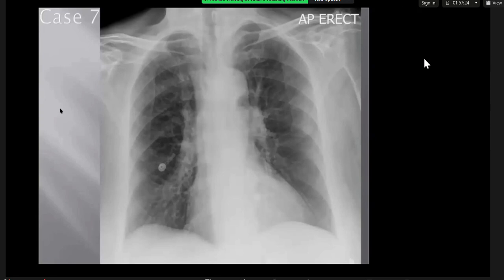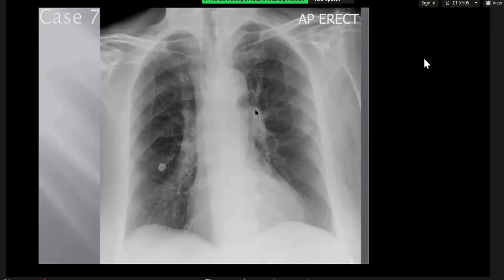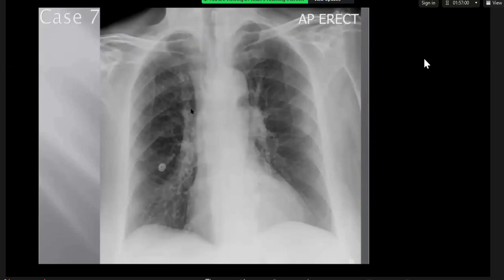It's quite obtuse on the right side. Yeah, it need not be acute. That's fine, as long as the point is not obscured. As long as this area is not obscured by a density, you can call it normal. And you're right that the left hilum is a little bit dense, which I would attribute to rotation, and I would suggest ignore that. All right.